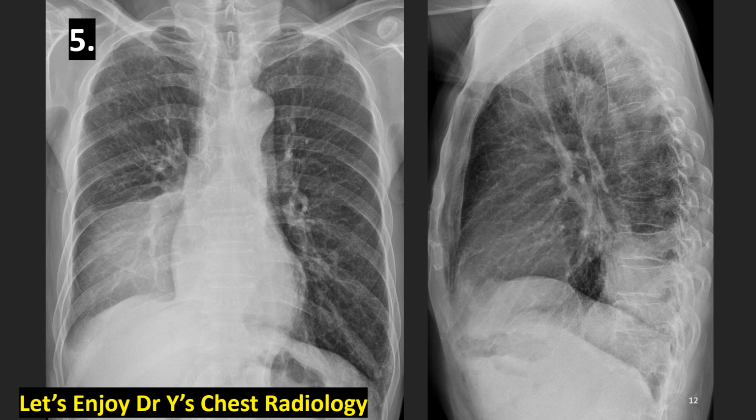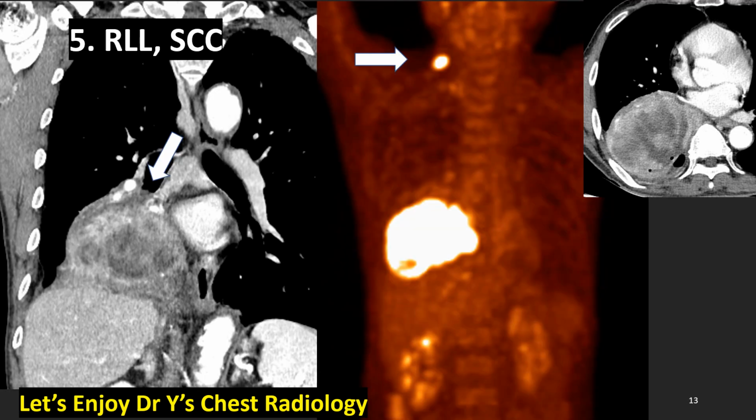What's the difference? Let's imagine. Let's expand our imagination. These films show the answer. You got it? This case does not show us collapse.